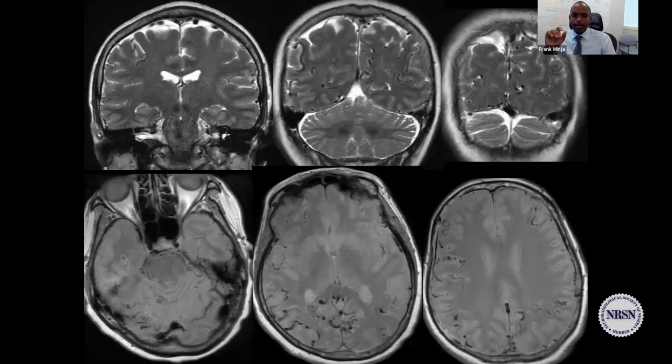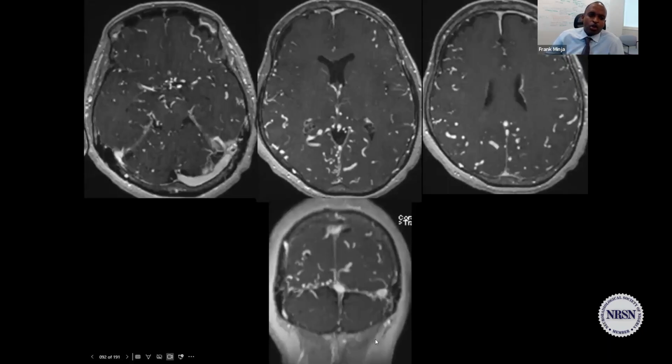So that was the bad one, the arteriovenous malformation. Here is that case. I'm just going to do this as show and tell. So you get this case. Oh my God, it's super crazy. What's going on? Why do we have all these squigglies? Why do I have all these serpiginous vessels all over the place on T2? This is a proton density. We give him contrast. Why are we having all these prominent structures?